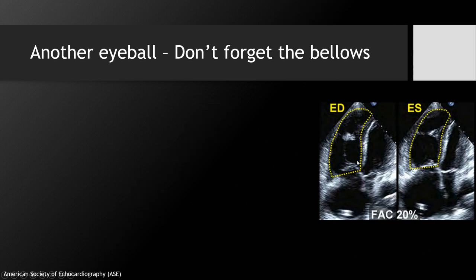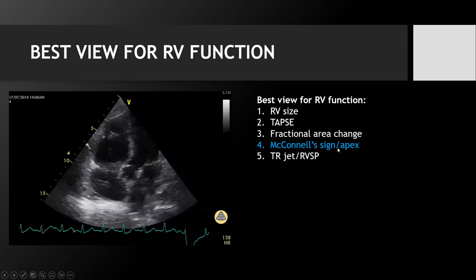So again, not saying anyone should be measuring this, not saying that you need to speak in terms of fractional area change, but don't get lost in the TAPSE and forget to look at the free wall that's contracting and how much that area of the RV is moving.